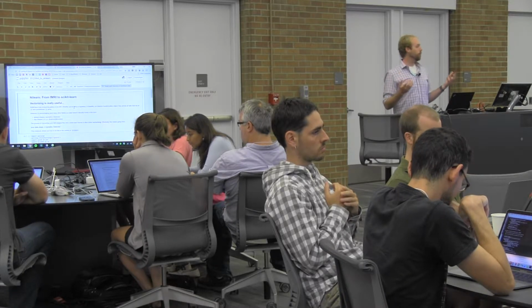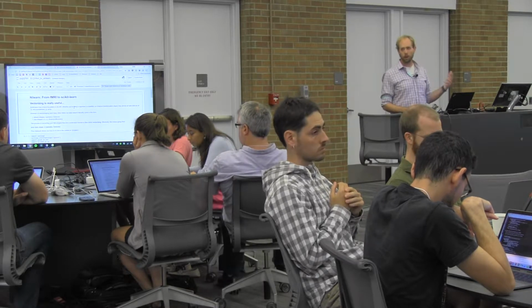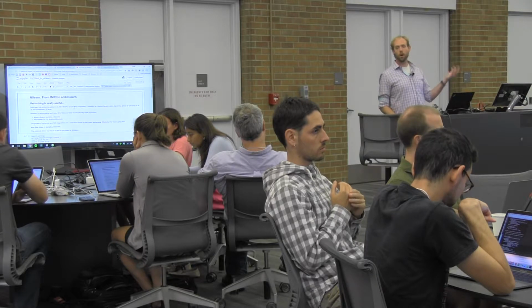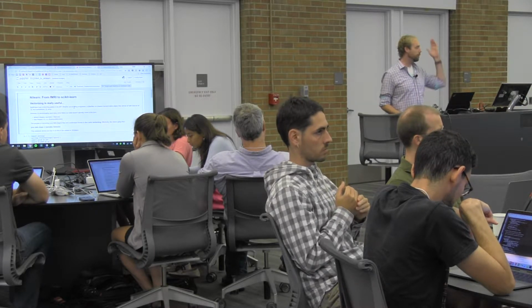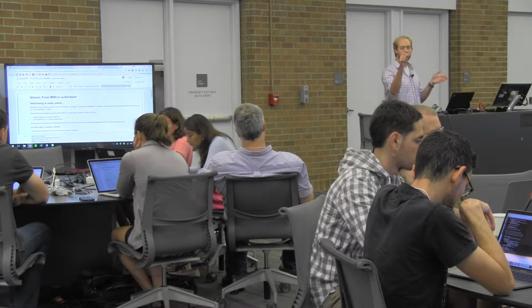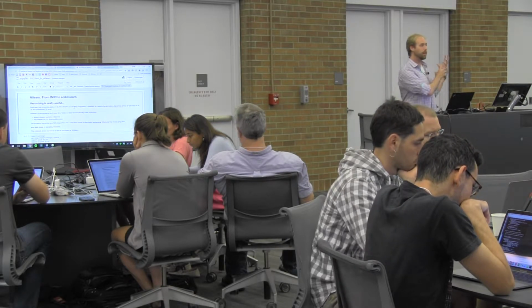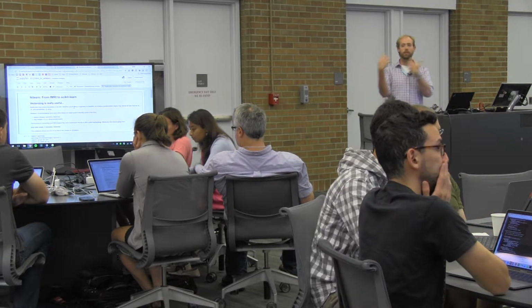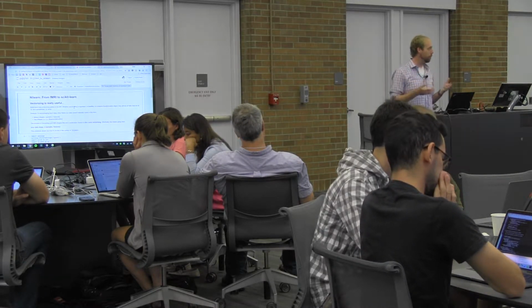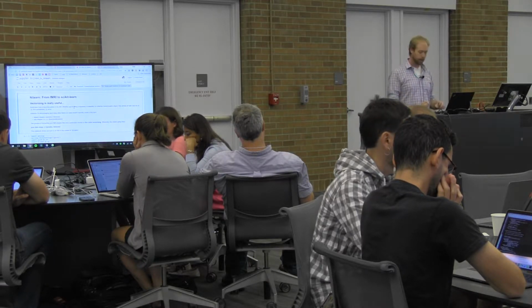So I mentioned before that neuroimaging data comes generally in the shape of IJK and time, or IJK and samples. But Scikit-Learn almost always expects data to come in the form of a matrix of shape number of samples by number of features. It's going to expect a 2D matrix. And in a simple sense, vectorizing just means taking data of some kind of a shape and turning it into a form of samples by features. And once it's in that form, it's easily able to be piped into the Scikit-Learn stack.